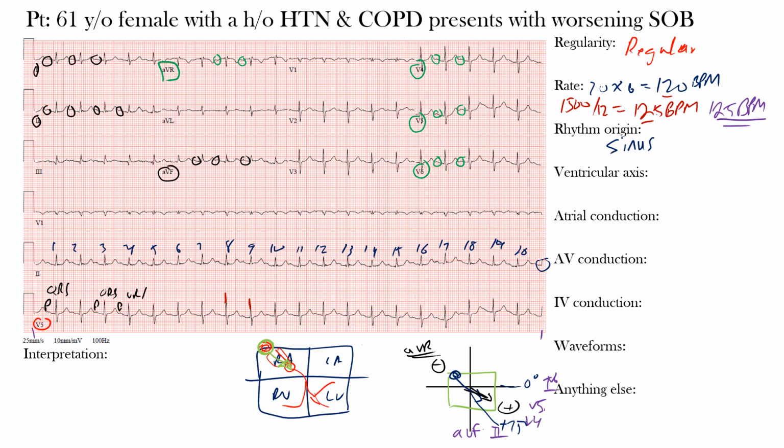So let's look at the ventricular or QRS axis now. You should have gotten a normal ventricular axis. The value here was actually positive 59 degrees, so it's normal. How do we know that? Again, we'll erase this so you can see it. When we talk about ventricular axis, that's where the mean axis in the ventricle is heading towards. Remember, the left ventricle is the biggest portion of the heart, the biggest ventricle, so it will often determine where the electrical axis is heading.